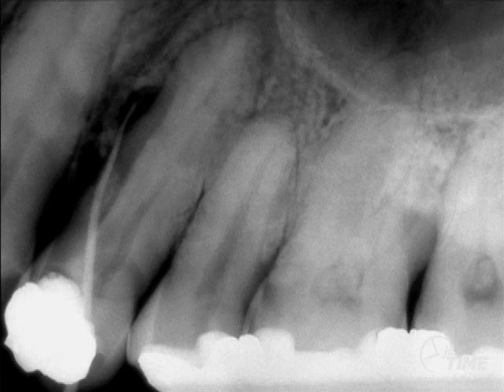In this maxillary first bicuspid, you can see that this gutta-percha point is tracing a sinus tract again to a lesion of endodontic origin. Notice the root proximity of the first bicuspid to the floor of the antrum. 20% of all sinusitis is odontogenic in origin. So it really behooves clinicians to roll up your sleeves proverbially and do the vital pulp testing when patients complain of rhinitis, postnasal drip, stuffiness in their nose, or maybe even unilateral suborbital pressure.